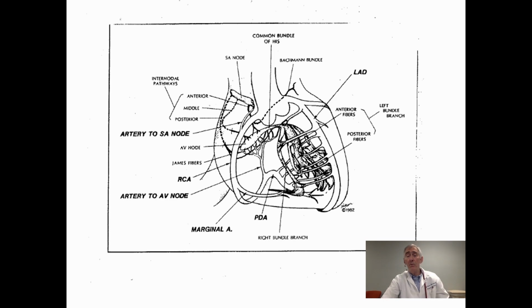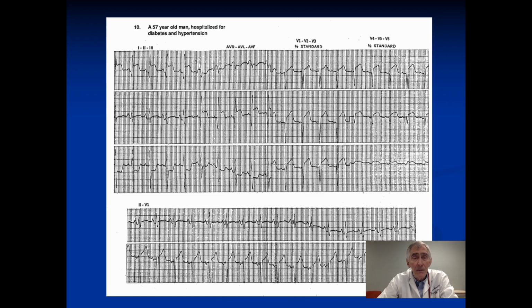Let's do a couple more. 13, 14, 15, 16, 17, 18, 19. So 19 times 6 is going to be about 110.